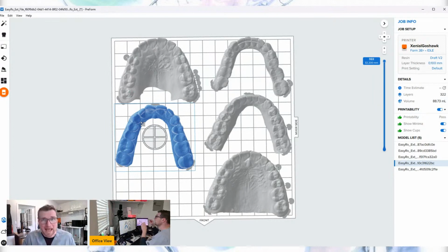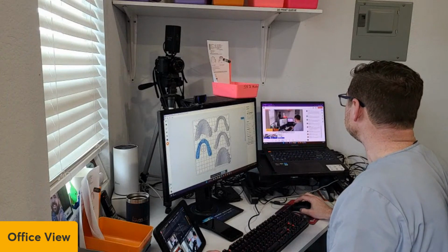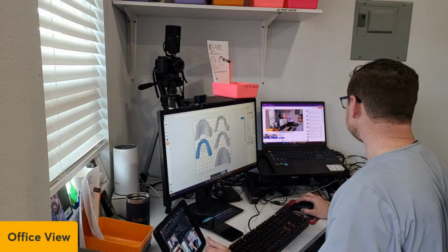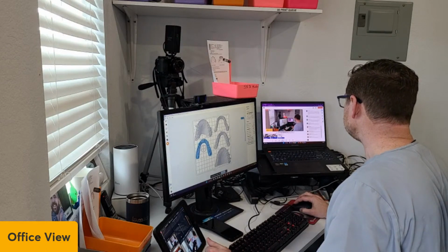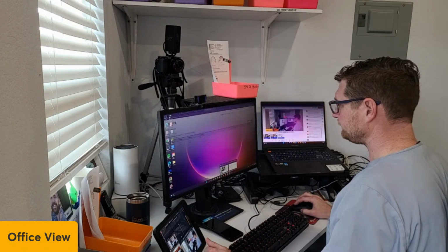So we're going to go back, and we're going to do one by hand, base one by hand. So now that I have these ready to go, we're ready for one more. And let me change my view because I don't know if the names are going to pop up. Here we go. All right, so this is my work area if you're just tuning in. And let's get back to here and here.